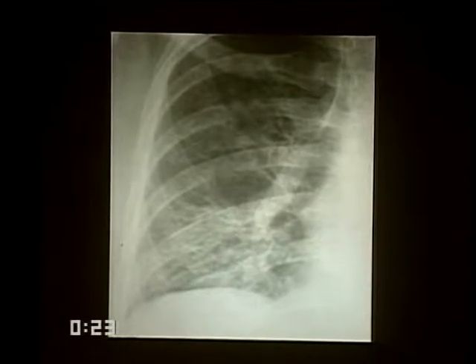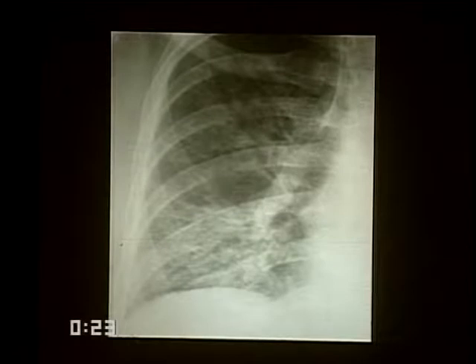We must always think of the connective tissue disorders. The textbooks will tell us that one of these connective tissue disorders can be differentiated from another by using very carefully defined criteria. I must admit that I am not able to do that. One must throw all of the connective tissue disorders into contention when there is a basal interstitial abnormality.